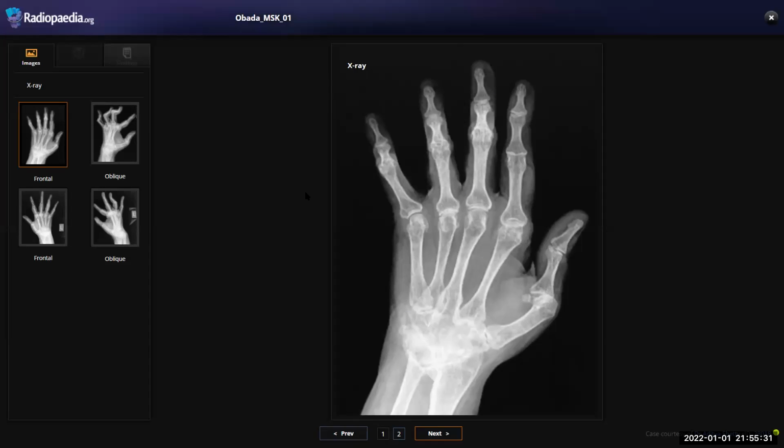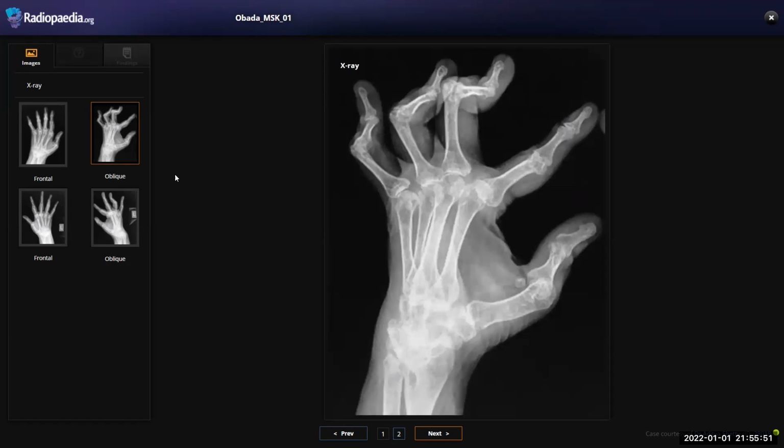I can also see some periarticular osteopenia, and there is significant reduced joint space at these joints with deformity at the metacarpophalangeal joints and proximal and distal interphalangeal joint, leading to Boutonniere deformities. So keeping in view a patient with such involvement, my primary differential will be rheumatoid arthritis, and further differentials might include osteoarthritis or psoriatic arthritis, and the patient needs urgent rheumatological referral for further management.